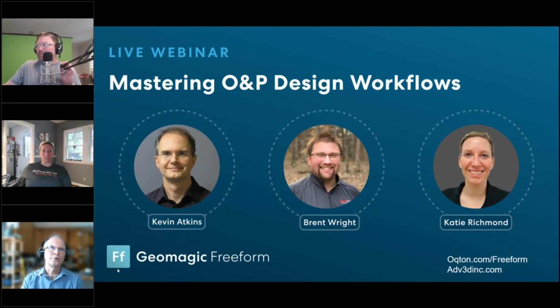And that's an important point. You say, you have a Dynabot for one workflow, one design, and you take it to another and it doesn't work. Generally, it's not that the whole Dynabot falls apart. It's generally that some part will fall apart. And that's the nice thing with Freeform. You automate as much as you can, and then when things fall apart, you still have that comprehensive tool set behind that you can pick it up and get your job done, so you're never stuck.